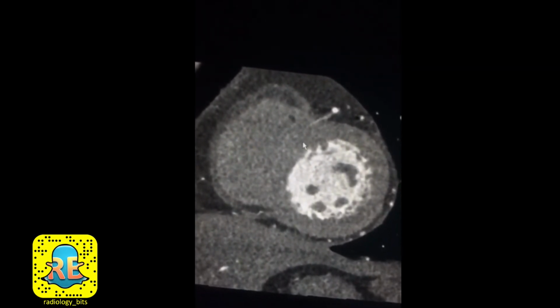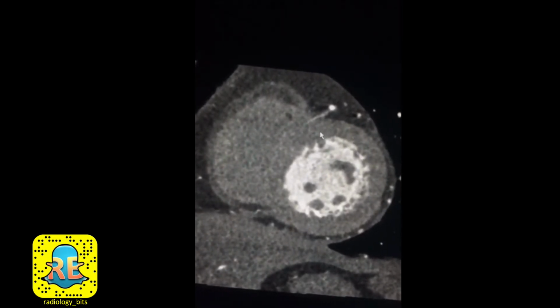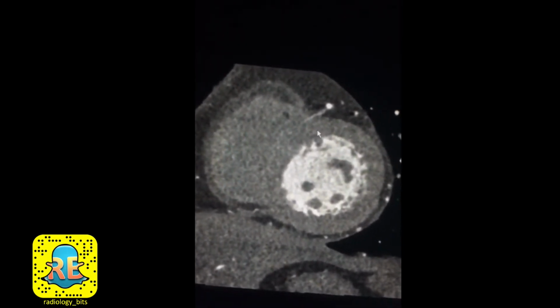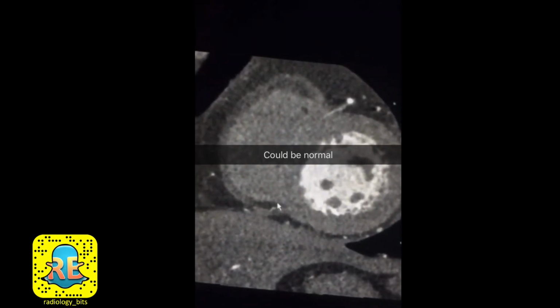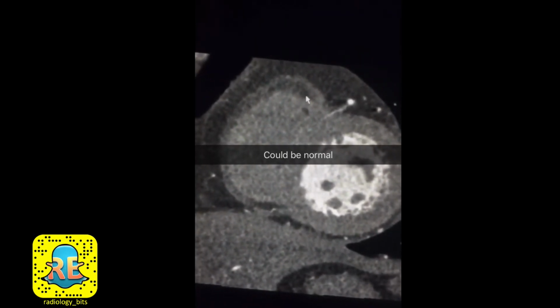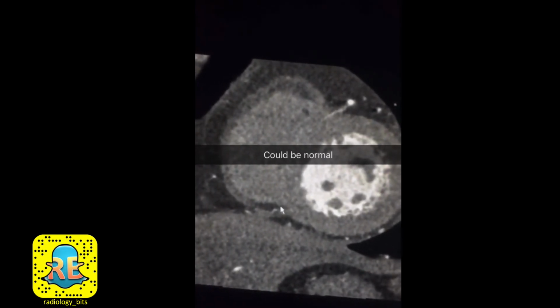We learned that there are various reasons for having fat within the myocardium. The commonest would be an old myocardial infarction. Another famous reason would be arrhythmogenic right ventricular cardiomyopathy, which you should never call if the clinical presentation is not supportive. It's important to remember that fat deposition in older patients, especially on the right side, is a common, normal process.